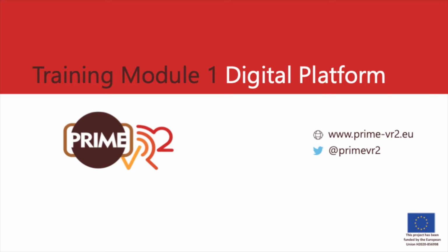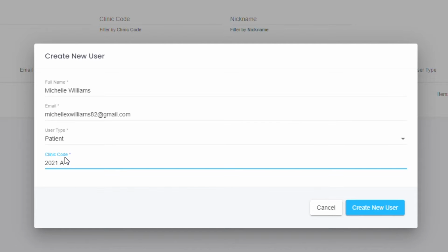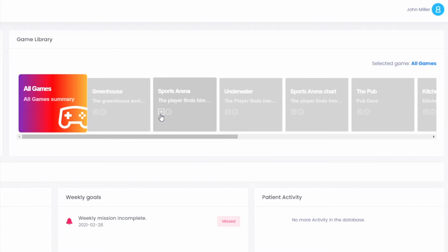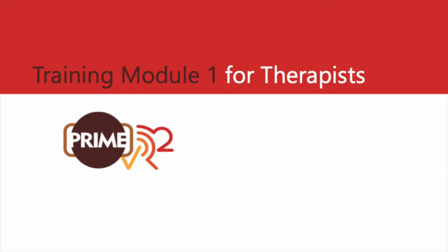Welcome to the first training module video regarding the digital platform. In this training module, I will explain the setup of the digital platform for therapists, followed by an explanation of the usage and setup for patients. Let's start with the setup for therapists.